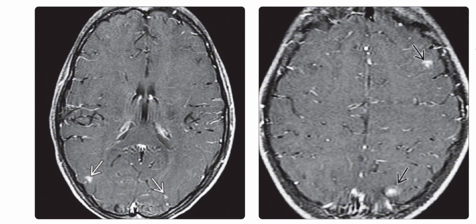Right is the more cephalad T1 contrast-enhanced fat-suppressed scan in the same patient, and it shows 2 additional micro-AVMs. Sporadic multiple AVMs are uncommon. At least 50% of such cases are eventually proven to have hereditary hemorrhagic telangiectasia, which is usually type 1.